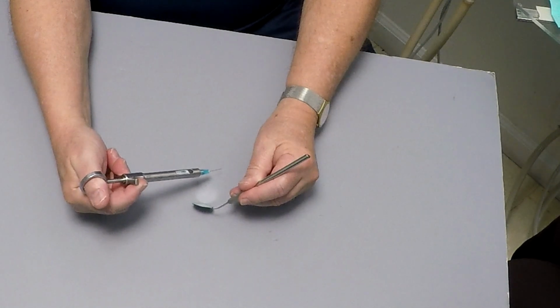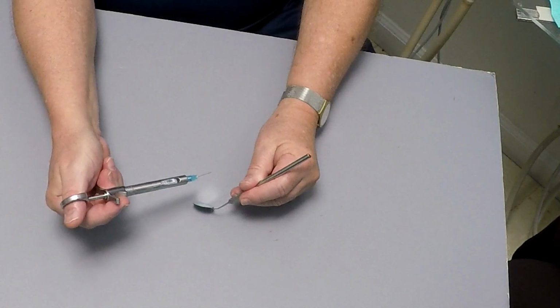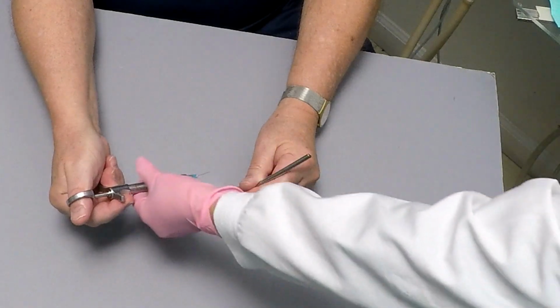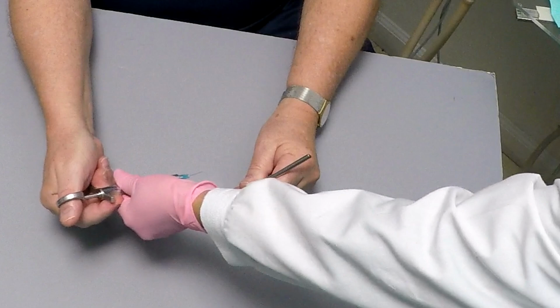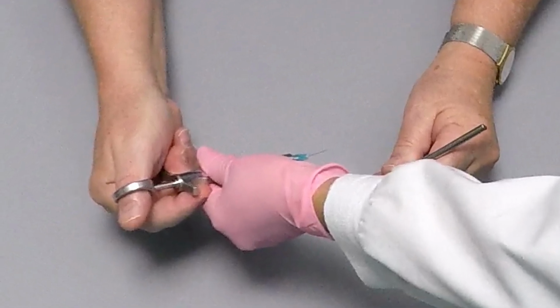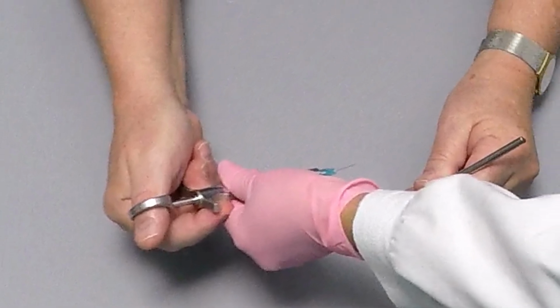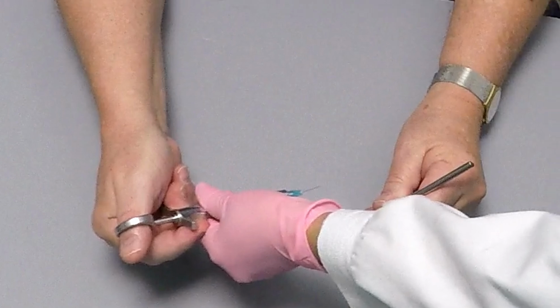Reviewing these with your assistant can really help you refine the technique very, very quickly. You can practice this for 15 minutes and really master the technique, completely eliminating any danger of needle impingement or errors.